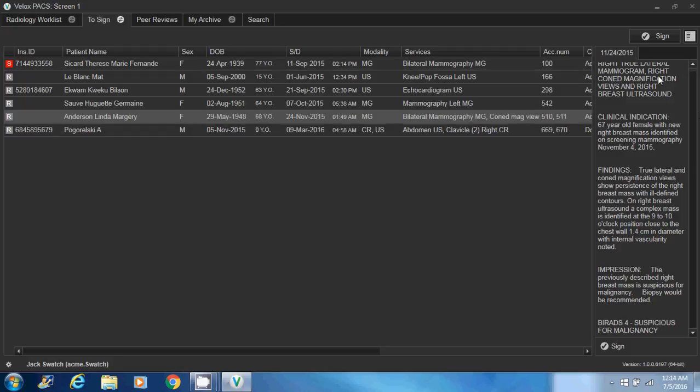You can either choose to sign one or sign all of the reports in this list. The top button will allow you to make your decision for one or all. Along the bottom, it will allow you to simply sign that one report. And this concludes our overall video tutorial for basic introduction to Velox Radiology Viewer.